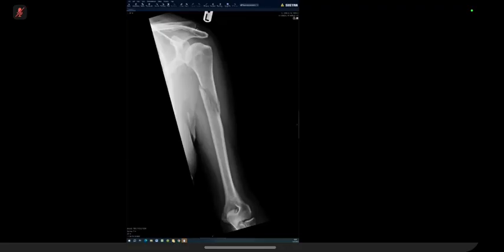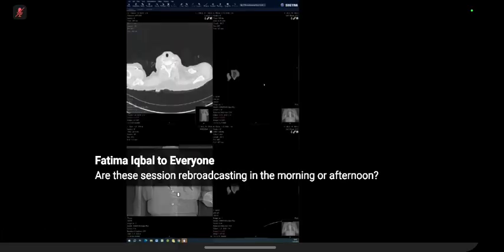So when you said this could be a metastatic deposit or it could be primary bone, are these your two differentials, bone tumor or metastatic tumor? Yes. This could be a primary bone malignancy. If this was a metastasis, what do you need to request before you go down the biopsy route? I would do a CT thorax abdomen pelvis to scan for the primary.